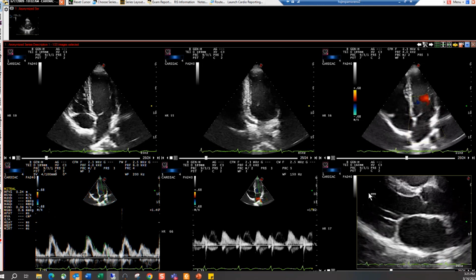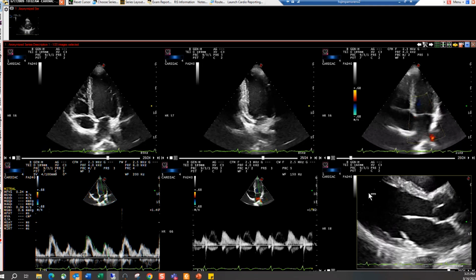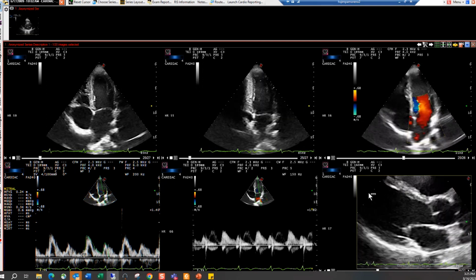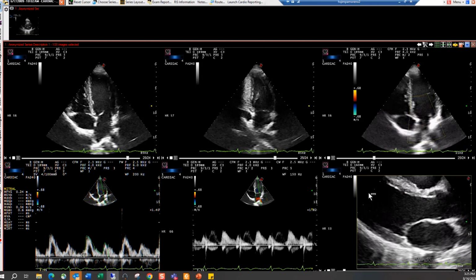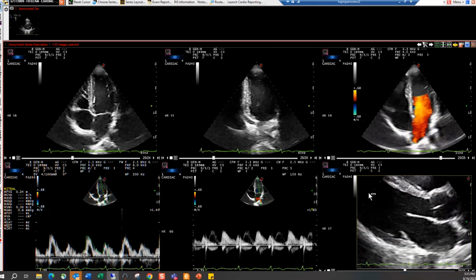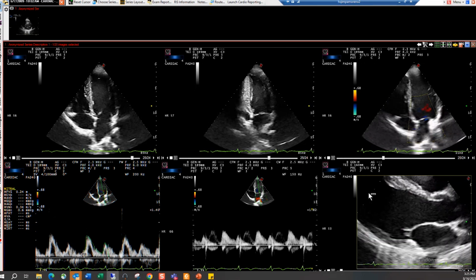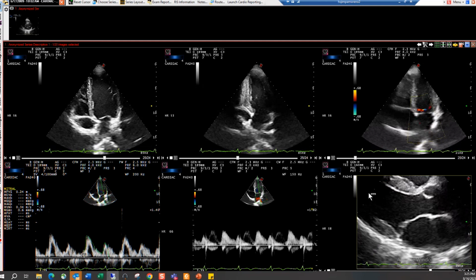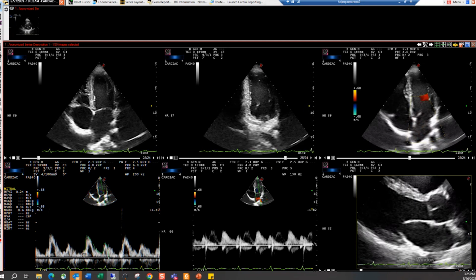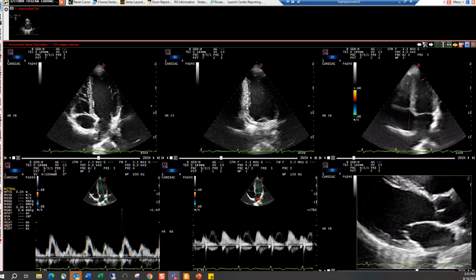The sonographer can review the images here. The attending can review the images here. If you have trainees, they can do it. And so it's quite a powerful tool, and it's flexible in the sense that there is a workstation component, and there's also a click-once viewer that can be launched anywhere. As you all know, if you're all NovaRad users, a lot of these features should be apparent to you, but just keep in mind that they also apply very well to cardiology images as well.